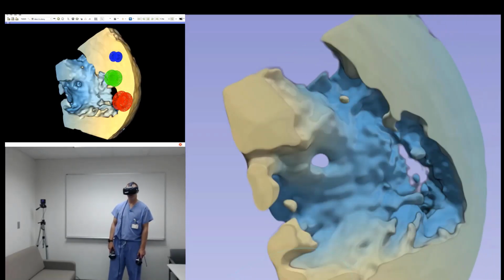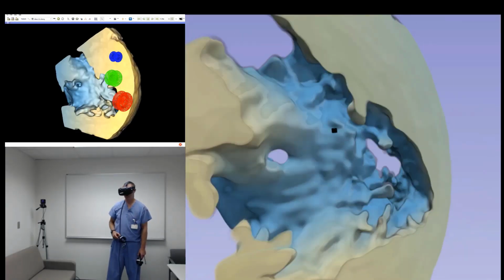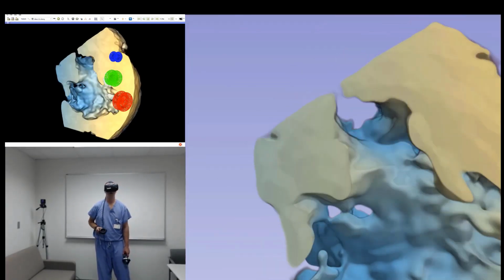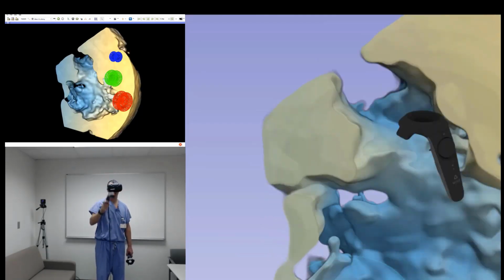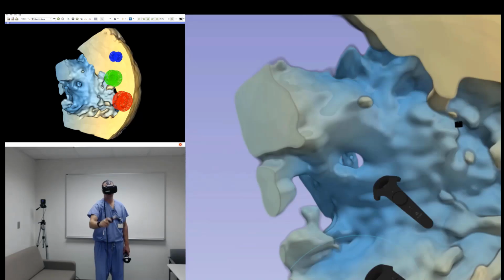We start with the view from the right ventricle. We identify the tricuspid valve, the right ventricular apex, the right ventricular outflow tract, and the ventricular septal defect.